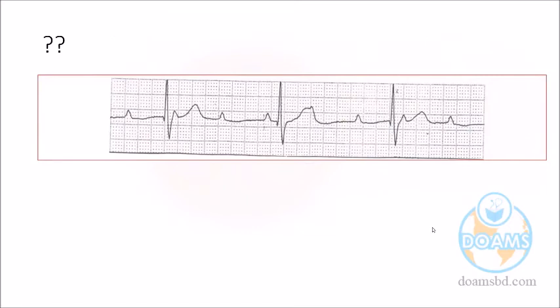Now, please, interaction. Try to interact. Who will give the answer? Please raise your hand, I will give you the mic quickly. What may be the block here? I am asking only the block. Don't be busy otherwise. Yes, Dr. Karishma, please.